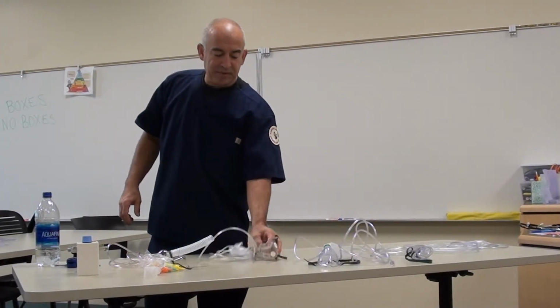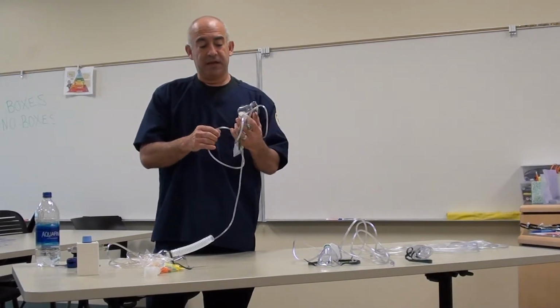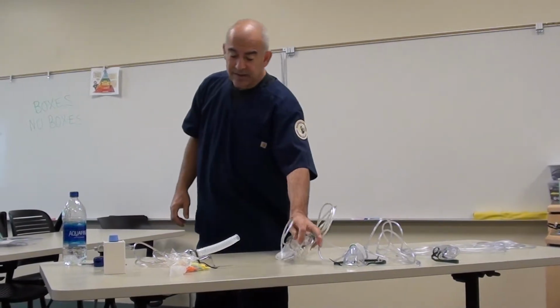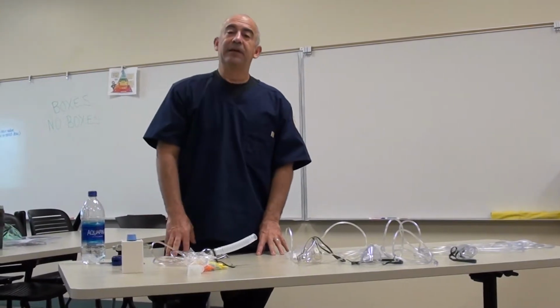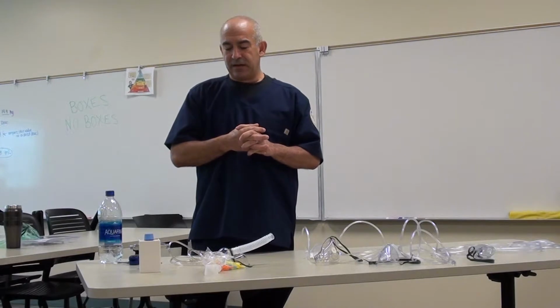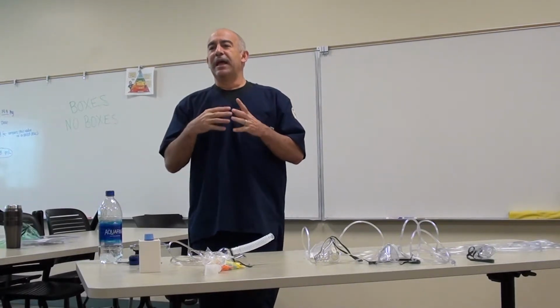And again, I hope I'm not repeating myself, but this particular device is good for emergency room patients and patients that require a high flow of FiO2. The next device I'm going to talk about today is a high flow device. To be considered a high flow device, it must ensure a fixed FiO2 and deliver oxygen at oxygen flow that exceeds the peak inspiratory flow of the patient.